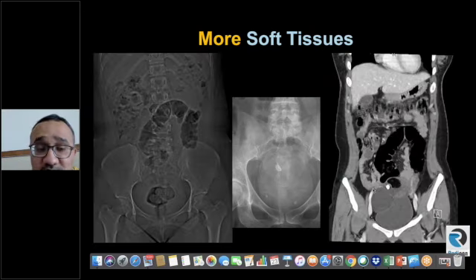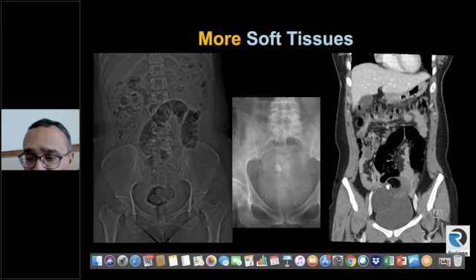an ovarian dermoid. This is another case which presented to our emergency with ovarian torsion. And then you can see on the scout film, you can see calcification again to the right of the midline. And on the coronal post-contrast CT image, you can see that focus of calcification is the tooth. You've got fatty component of the dermoid with soft tissue, and then there is a large ovarian cyst concomitantly in the right ovary. This patient was taken to theater and the ovary was found to be torted.